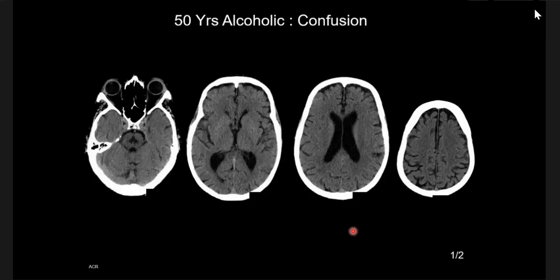Okay, presented with multiple axial slices of a non-contrast enhanced CT head of a 50-year-old alcoholic with confusion. There is periaqueductal hypodensity. So is this periaqueductal? What part of anatomy is this? No, it's not periaqueductal, I apologise. That's in the mid-pons. Yes, it's in the pons. Apologies.